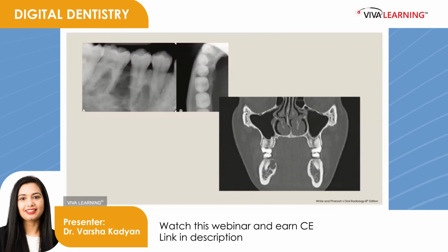These two radiographs here also show the radiographic appearance of ameloblastoma. The first one is a periapical film, and the second one is the occlusal image. And you can see the presence of short septa developing into ameloblastoma here. The second image on the lower right is the coronal MDCT image. The size of the ameloblastoma often dictates the aggressiveness of its management. The most common treatment is the enucleation with surgical resection.